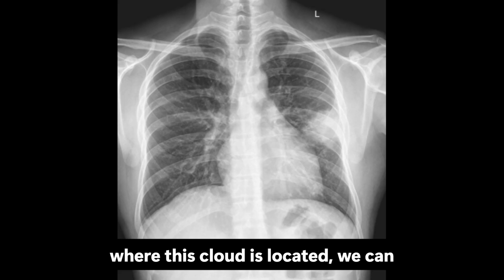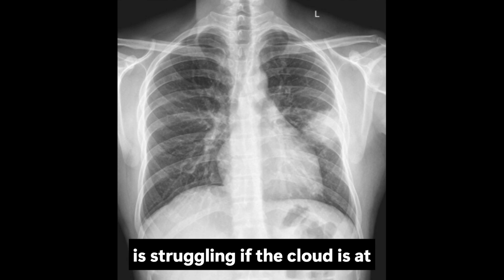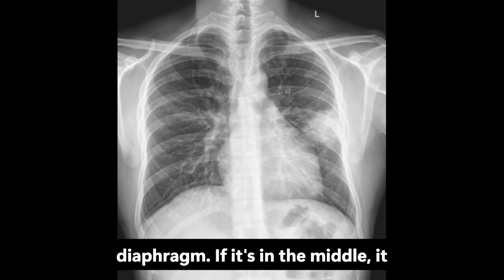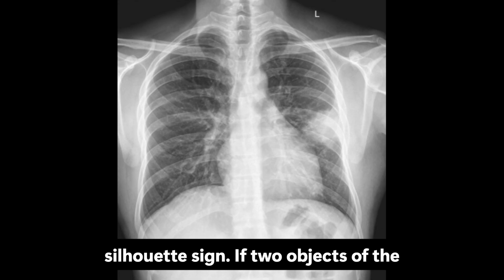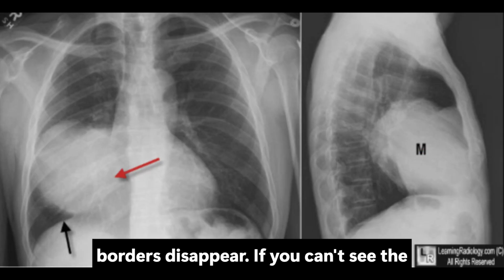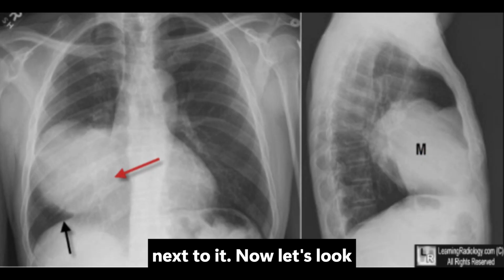Depending on where this cloud is located, we can tell exactly which part of the lung is struggling. If the cloud is at the bottom, it might be hiding the diaphragm. If it's in the middle, it might blur the edges of the heart. This brings us to a critical concept, the silhouette sign. If two objects of the same density touch each other, their borders disappear. If you can't see the edge of the heart, the pneumonia is right next to it.